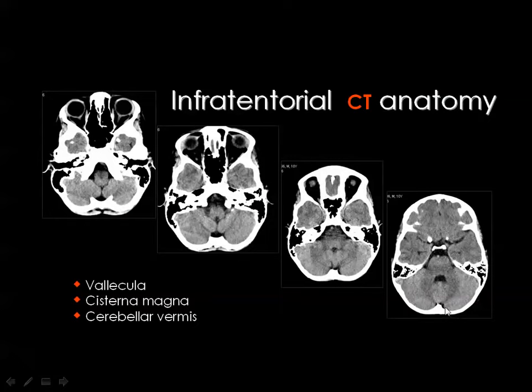Then if you look at the fourth ventricle, it is large. Then you go inferiorly, the fourth ventricle will be small. Then anterior to the fourth ventricle, whenever it is small, in the lower sections, is the medulla oblongata. This is the medulla oblongata, left cerebellum, right cerebellum.